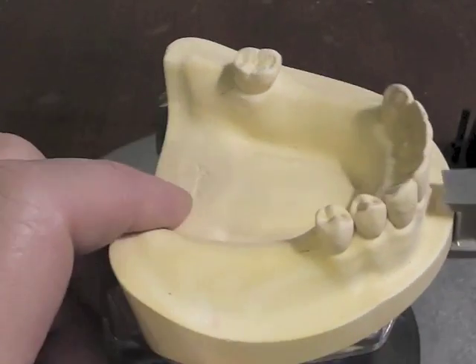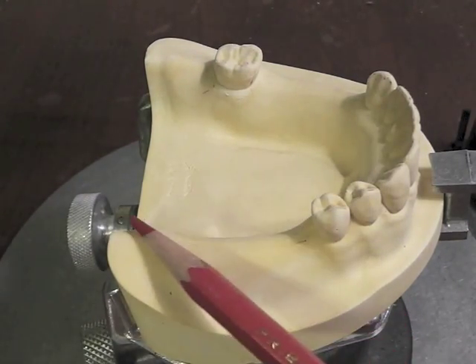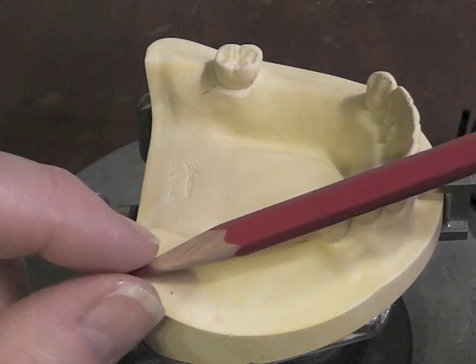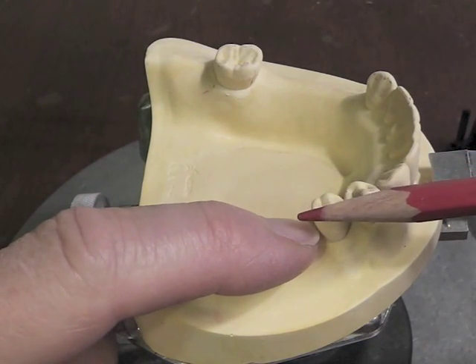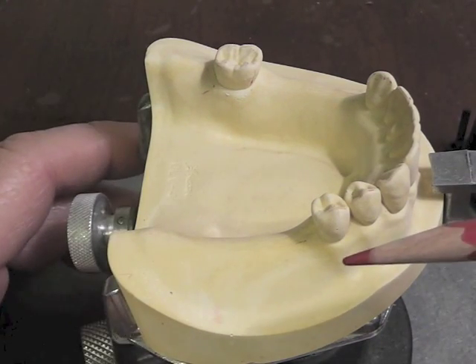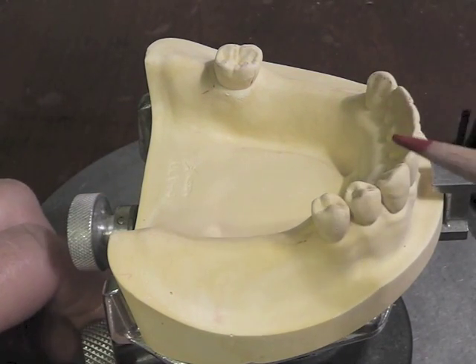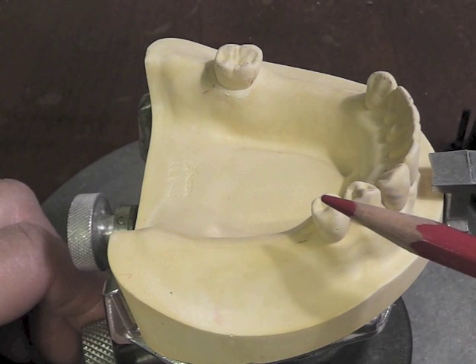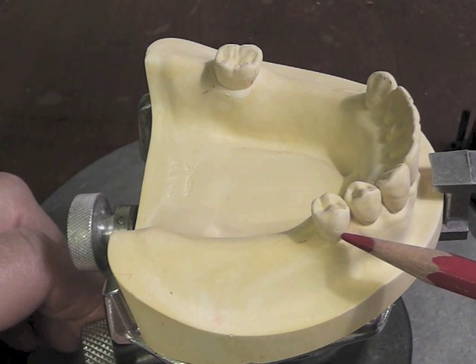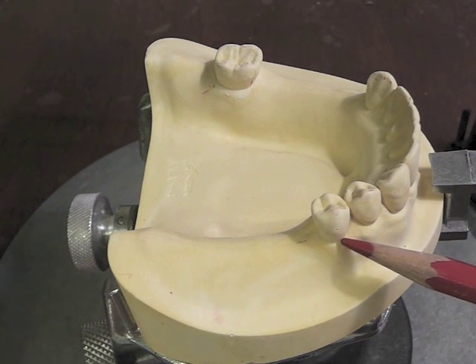Our last little guy over here, he is the tooth on the extension base side of this partial denture, and it takes a beating when we bite down on that side. This tooth is going to have some considerable torquing forces placed on it. So on this tooth, we're going to use one of those 4 methods of clasping that were presented to you in lecture, and those were the RPI system. Again, that relieves stress. That's probably our number 1 choice.